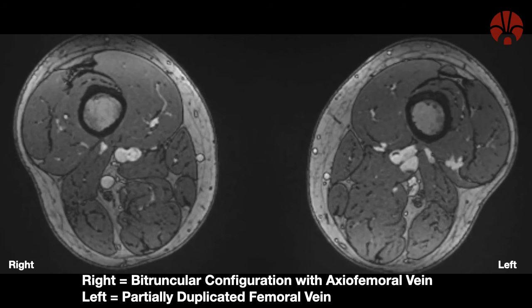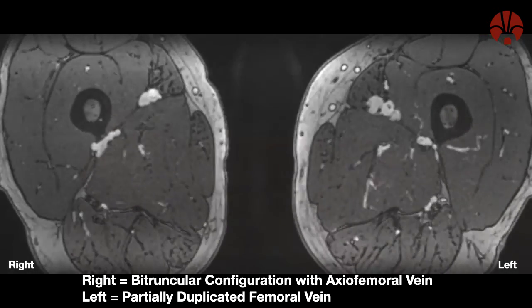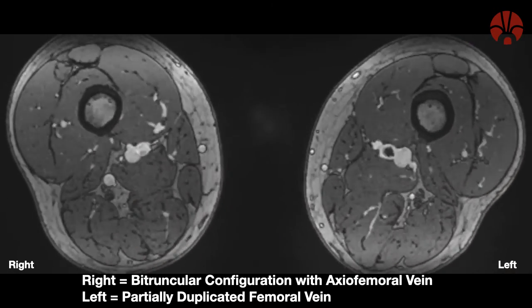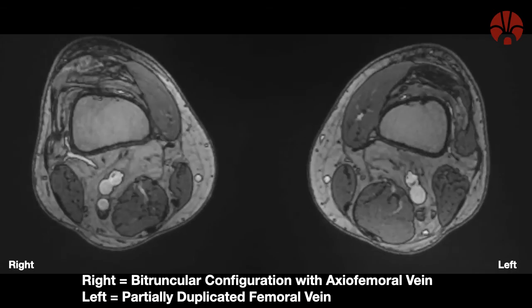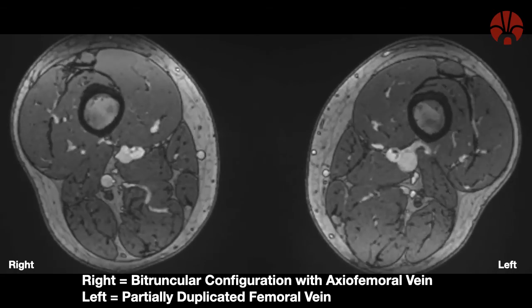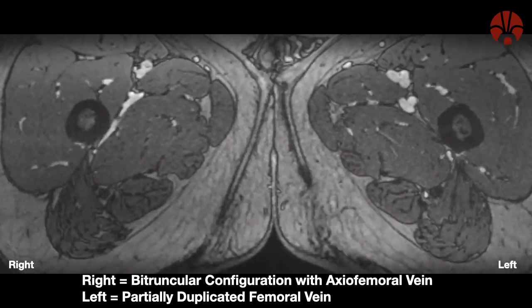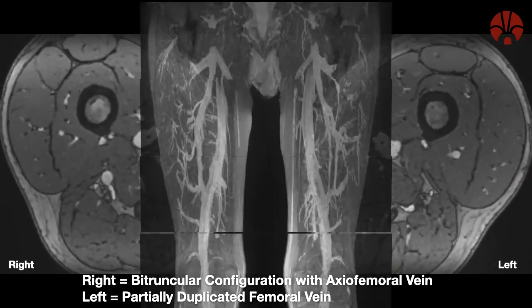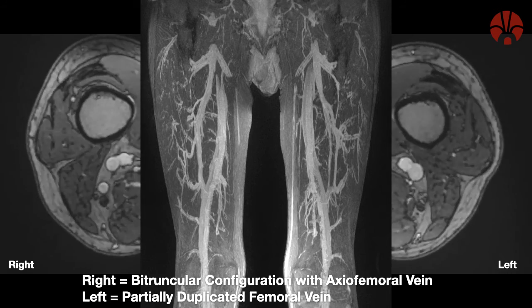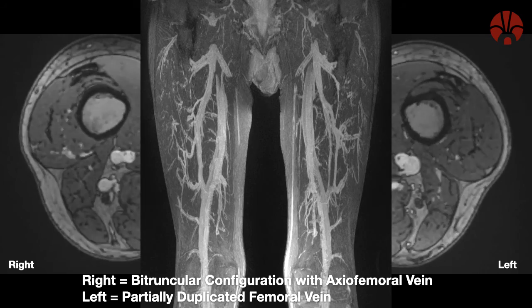Here's another example in a patient with, on the right side, bitruncular configuration with an axiofemoral vein, and on the left, a partially duplicated femoral vein. As you can see, we get exquisite anatomy of all the musculoskeletal parts as well, which can sometimes lead us to make other non-vascular diagnoses. This overview slab MIP nicely shows the axiofemoral trunk on the right side.